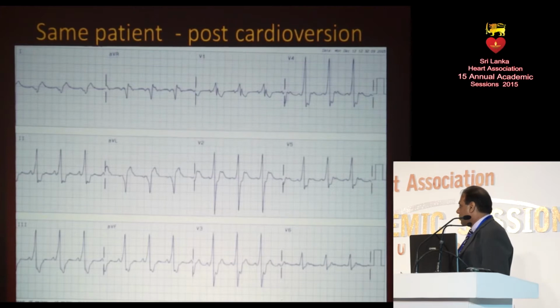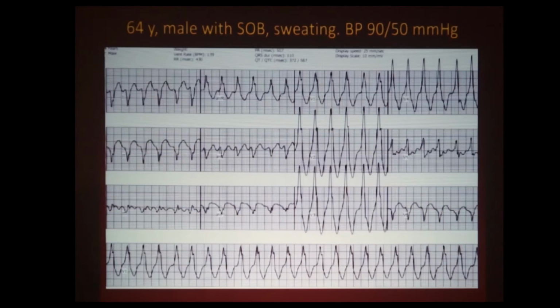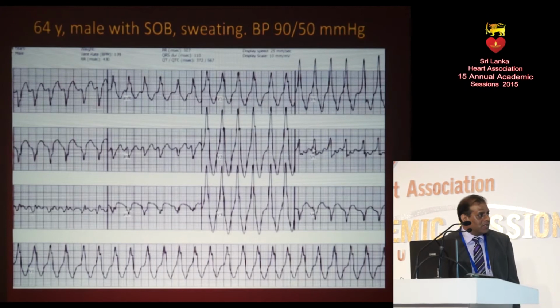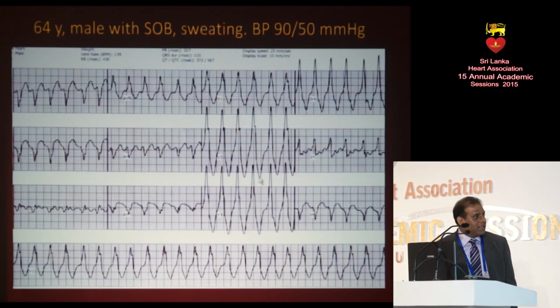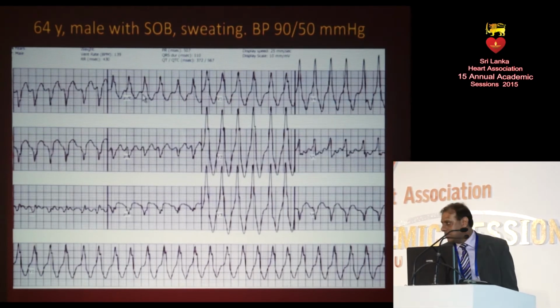I would invite comments. Should we go back? If you go back on the tachycardia, it's extremely wide. If you want to differentiate between the two, you need to look for a delta wave and probably a P wave. You might not see it in all the leads, but here in the V5 lead, you can see a P wave as well as a delta wave, right? And in the other leads, you might not see that. In aVR, yes, you might be able to see that.